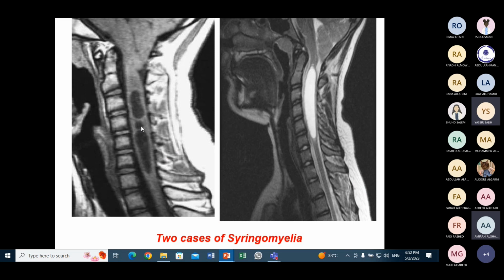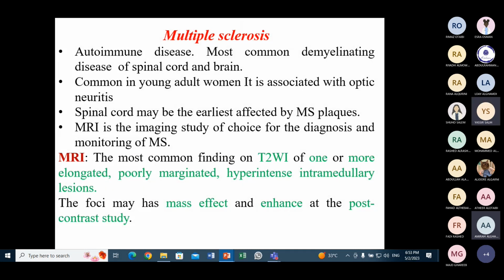فدي مثلا اللي هي لاحظوا إنه spinal cord this is T1 and this is T2. spinal cord ماله حصل له شنو؟ cystic lesion within the spinal cord. فدي لأنه فيها CSF لذلك هي of low signal or hypointense in T1 and on T2 بتكون لنا شنو of high signal. فدي شنو high signal in T2. فدي syringomyelia. نتكلم قليلا عن multiple sclerosis.